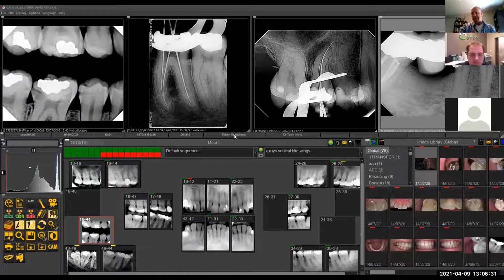Okay, so it's connecting the two databases, so you don't have to worry, you don't have to enter in all kinds of new patients. It's basically going to be linked at all times. This is how all imaging software works. And I really don't care if it's seamless, companies that say it's seamless, it's all linked behind the scenes, okay?